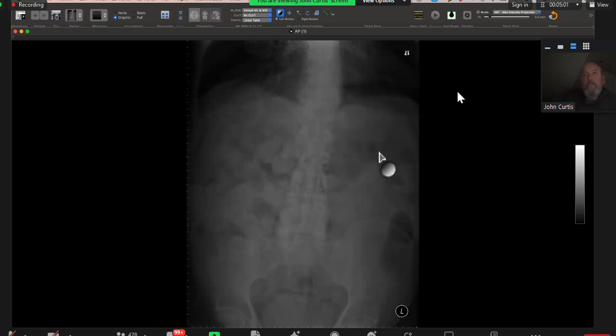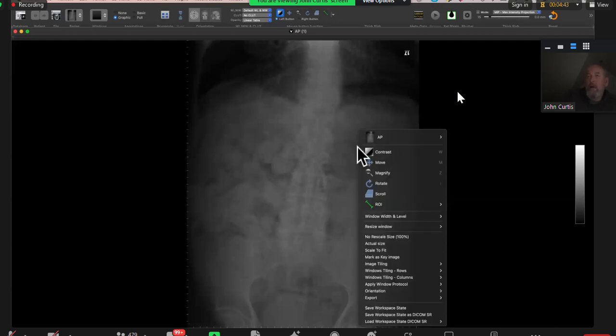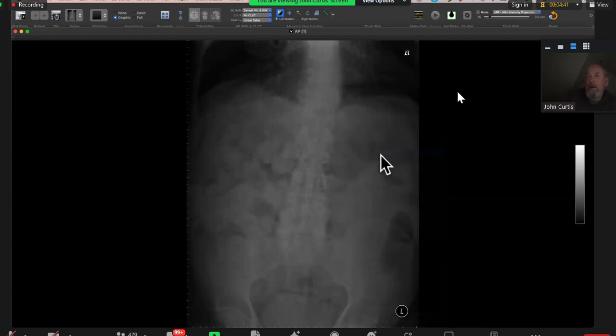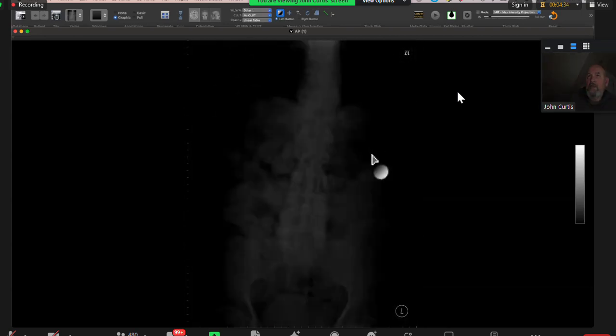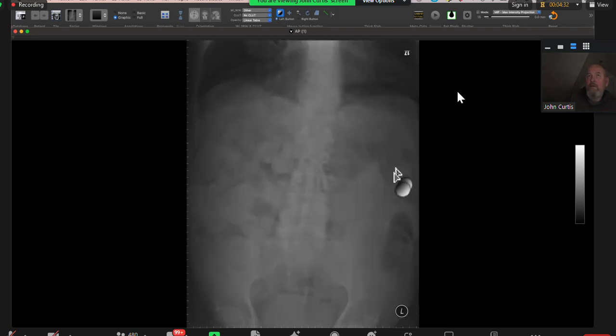Over here, these. You need to click before you move your mouse. Sorry. Yeah, over here. That's fine. These ones over here, feces. It's normal. Okay. Can I change the window a little bit? Please do. Because I cannot clearly see. If you use your left mouse, left click, and then press down. That's it. Good. Move up. That's it.